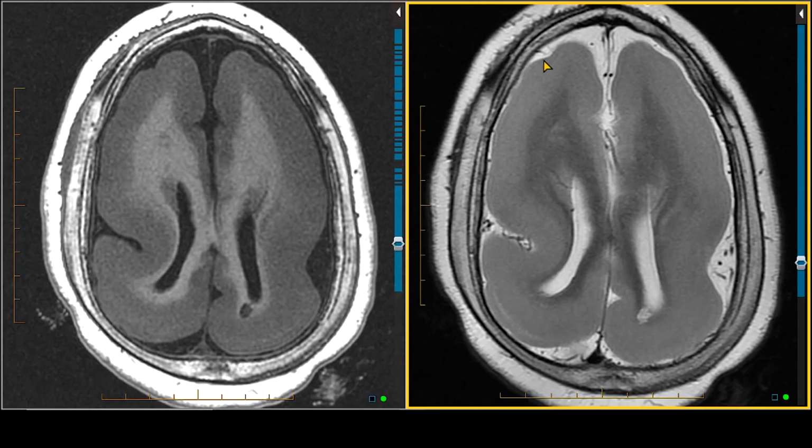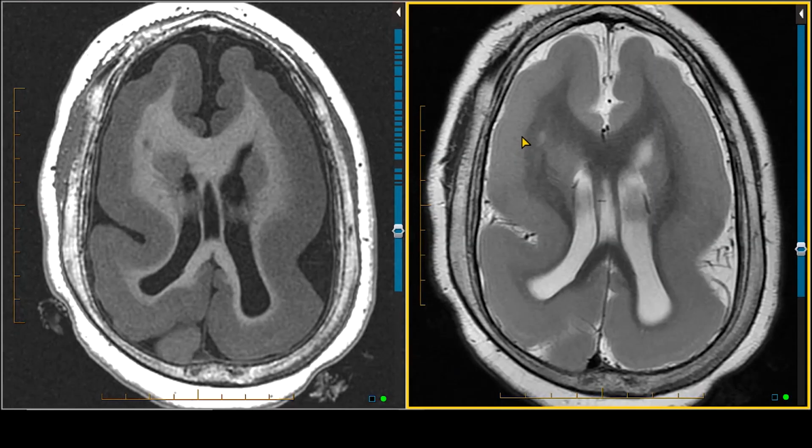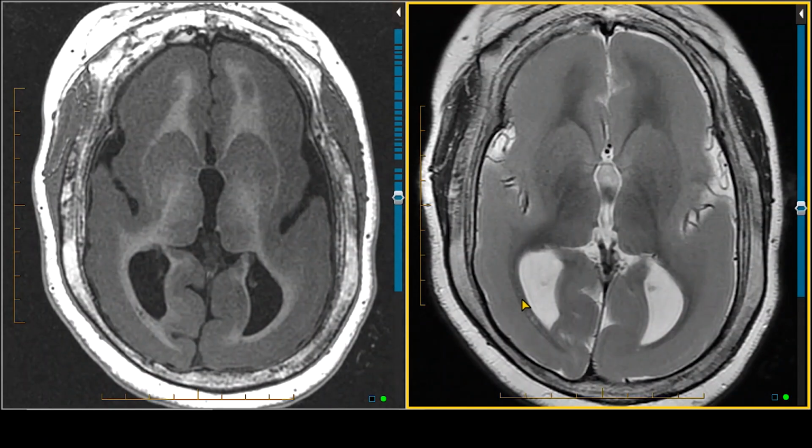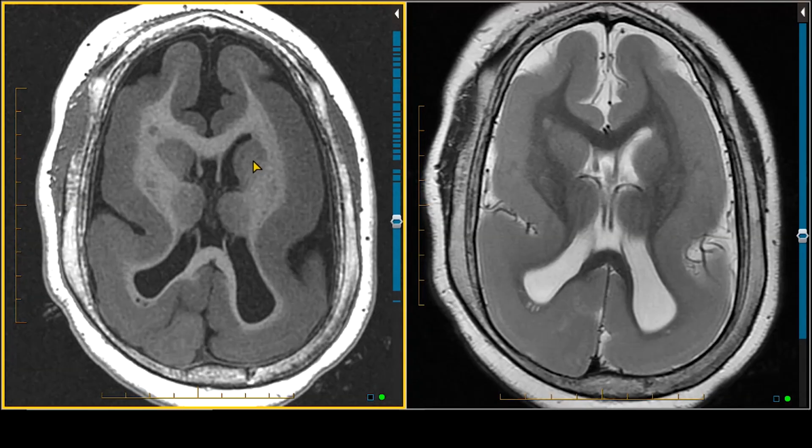The smooth surface of the brain is known as lissencephaly. Lissencephaly, especially the more severe forms, is often associated with a band-type heterotopia. Band heterotopia is an abnormality of neuronal migration. We can see other abnormalities here, that there's a severe loss of the cerebral white matter volume. Overall, the brain doesn't have a lot of the landmarks we're used to seeing.